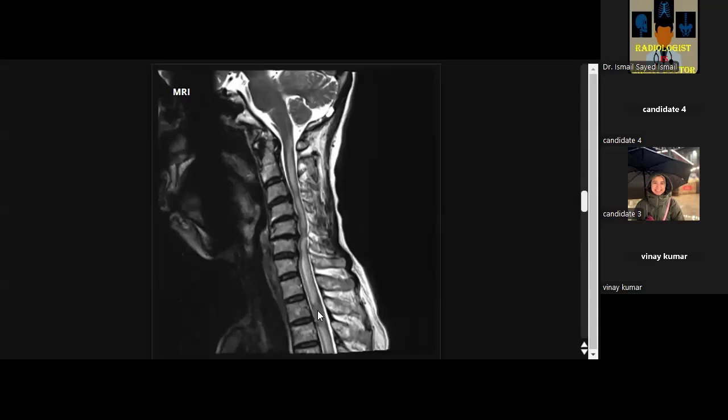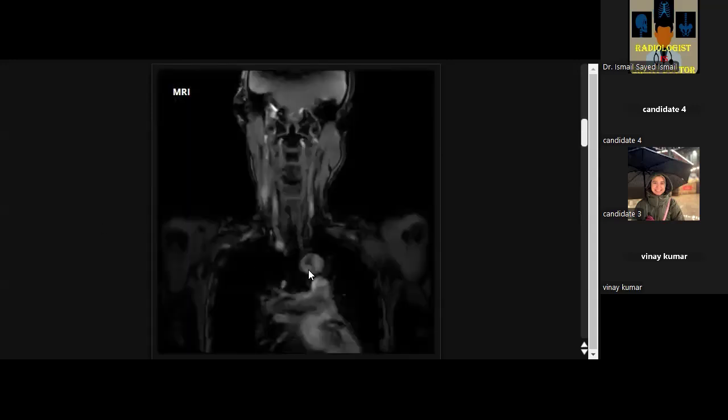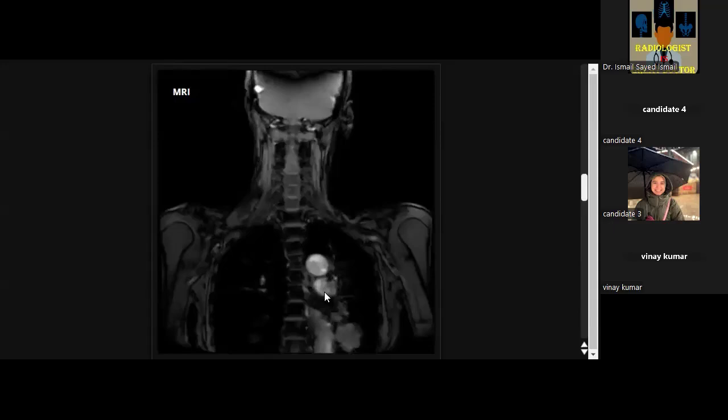But remember, in the exam setting, the lesion may be present at the edge of the film. Film edge is a classic exam case. So with massive cord edema in T2, look for a lesion, even a small lesion. In the localizer here, the lesion is present in the left lung, so metastasis. So a four differential diagnosis for intramedullary lesions in the spine: ependymoma, astrocytoma, hemangioblastoma, and metastasis.